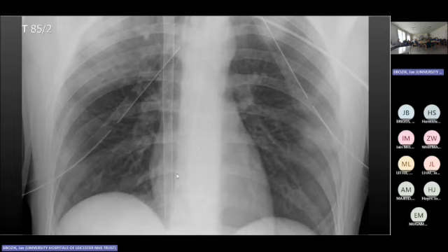So this time the ECMO cannula, well, it was a bit higher, but it was working fine. So that's fine. But that patient is a young chap. And if you want more details, speak with Cass. I think that was her first ECMO patient, if I'm not mistaken. So the lungs look relatively okay. Obviously, we have ECMO cannula, we have large chest drains, and then we have those opacities. Yeah. So what is that?